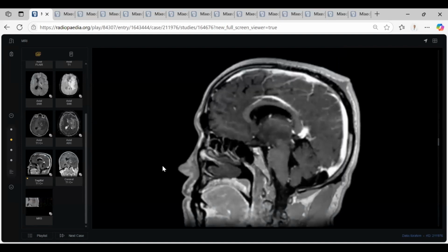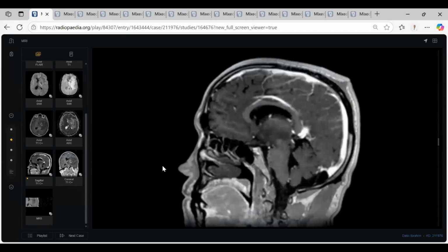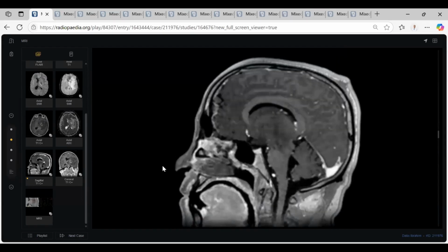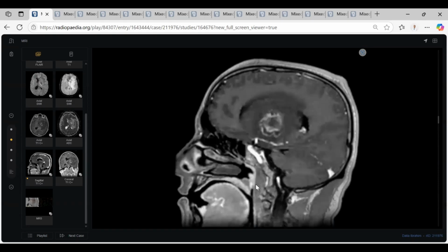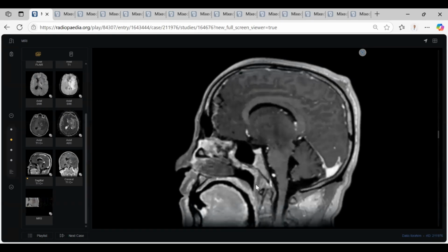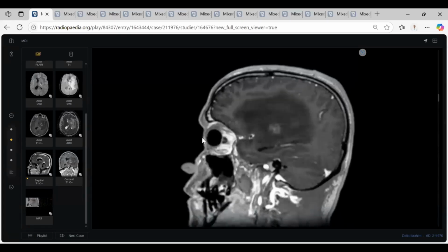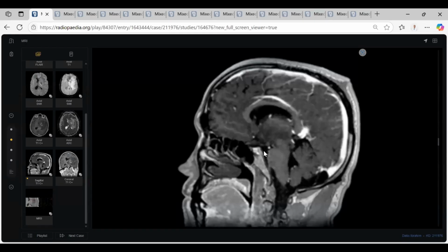The only thing you forgot, as I told you before in many lectures, my colleagues, is to ask for sagittal post-contrast, especially in a tumoral case, to rule out, number one, tonsillar herniation, because there is massive cerebral edema. Number two, any skull base infiltration or destruction. Number three, leptomeningeal deposits, which are very common here in the basal cistern, and also in granulomatous disease.